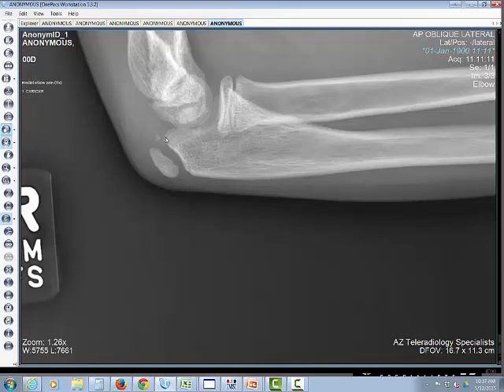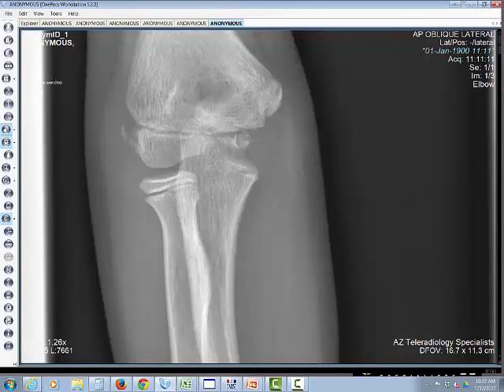The other source of confusion with the olecranon are these small accessory ossifications. It's very typical to see these. These are not going to be fractures. You may also even see a bipartite apophysis here, so you have a lucency or a line going right through this center here, and those are all within the spectrum of normal variation. Okay, so let's show some abnormal.